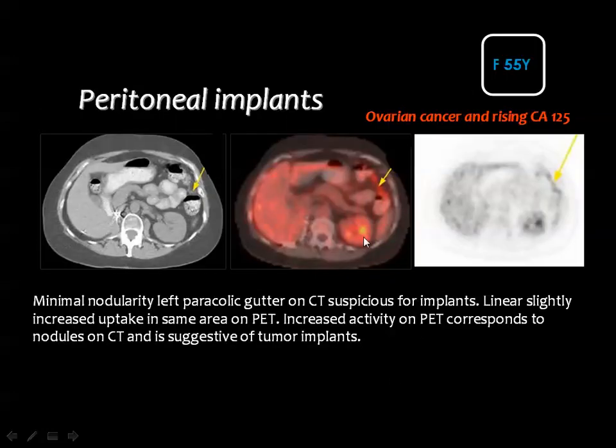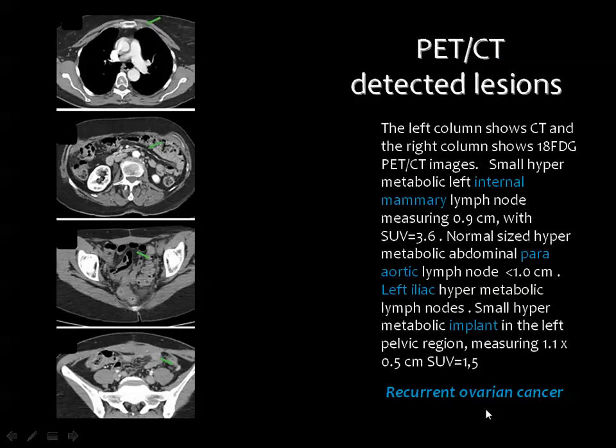And this is the same in this CT. You see something here, and it shows some uptake in the PET CT. In the context of elevated tumor markers, it should be considered.